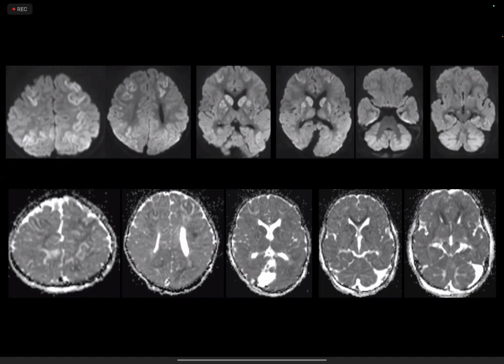The bilateral basal ganglia demonstrate these confluent patchy abnormalities. The thalamus also has restricted diffusion. The midbrain, especially the ventral aspect, the cerebral peduncles, also demonstrate restricted diffusion. So deep brain nuclear abnormalities with cortical subcortical areas involving the bilateral hemispheres and also brainstem involvement. The cerebellum also has some degree of edematous changes in the bilateral hemispheres.